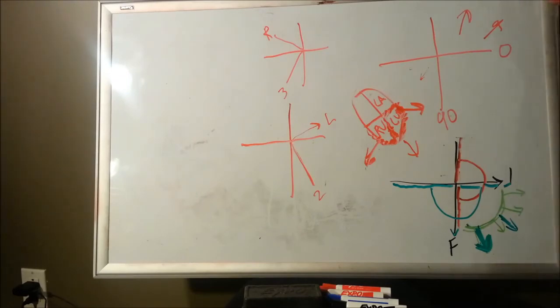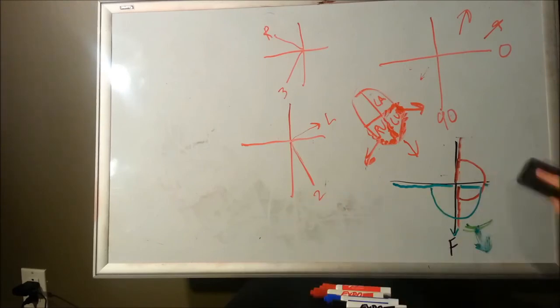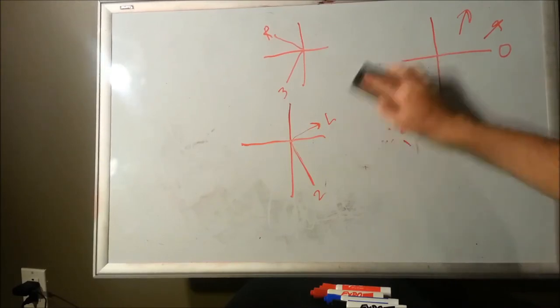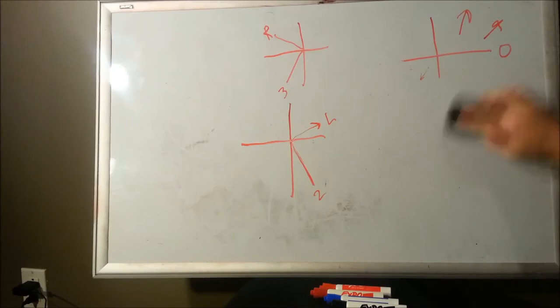Anything in the upper quadrant is going to be a left axis shift. Anything down in this bottom quadrant is going to be a right axis shift. And using these clinical tools, you'd be able to find out a lot about the heart. You can find out the net vector force, and then if you look further, you can find some pathologies in the EKG tracing.